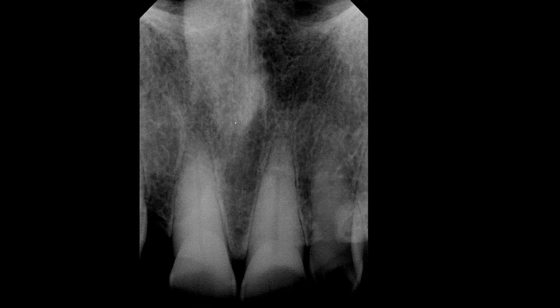Additionally, we see this kind of soft tissue radiopacity extending all the way down, and that is the soft tissue of the nose. But just the way it's shaped, it's so elongated, and I'm not really seeing the ala of the nose, so this most likely represents, I think it's called, the columella of the nose. And although it's difficult to determine the exact border, this radiolucency in between the two central incisors is the nasopalatine foramen.